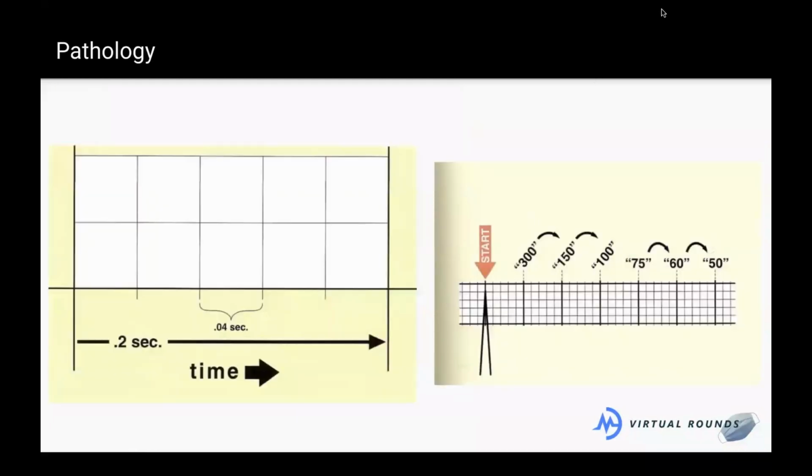So that's basically the bare bones of what each of the little peaks mean. Stop me if you have questions. Now we're going to talk about how we can use the EKG to calculate rate. You can do some mathy stuff, but I'm not very strong in math, so I use a cheat method.